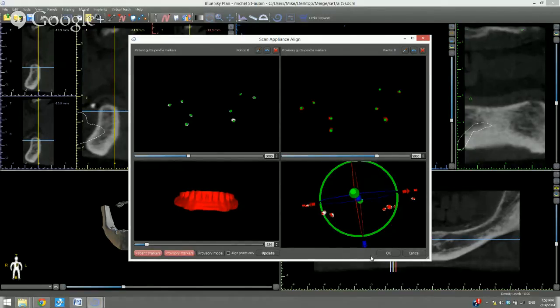Sometimes, even without marking the markers, you have the density threshold sliders underneath each view. Raising the density threshold often clears up a lot of noise. You could use that as a first resort. You could raise the density threshold, press the Update button, see if the merge is done properly. If it is, great. If it's not, then you can mark the points, see if the merge is done properly, and do it that way.